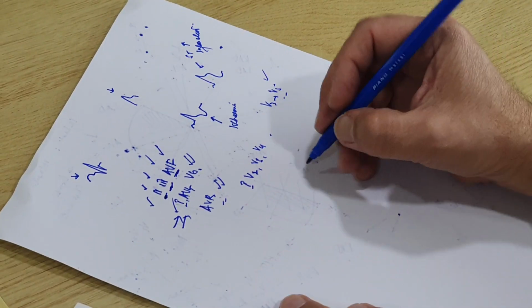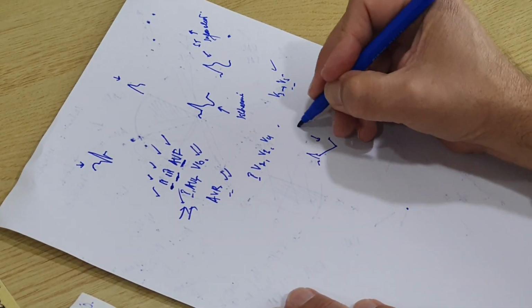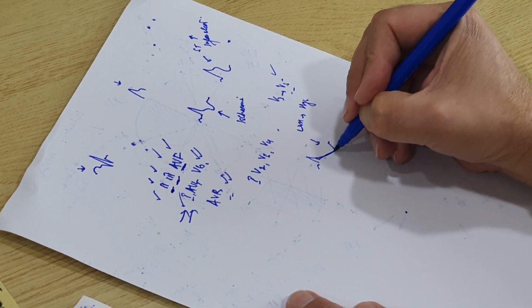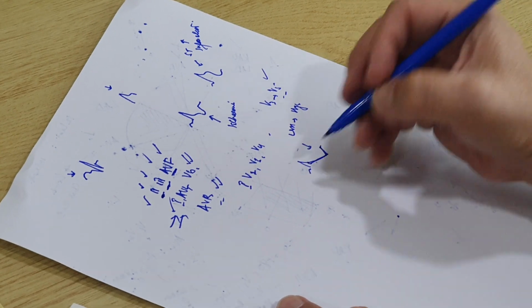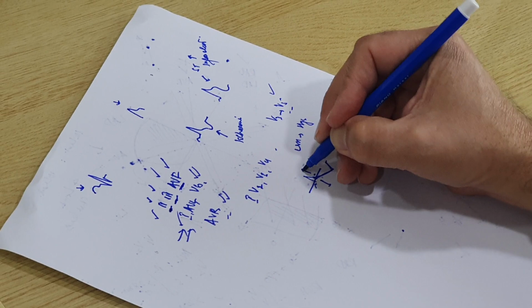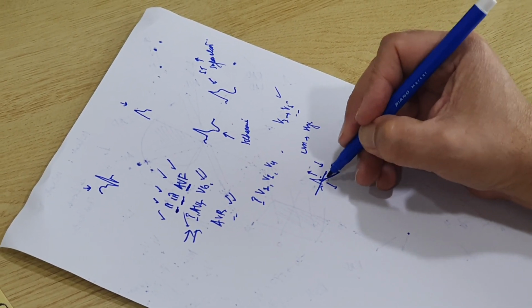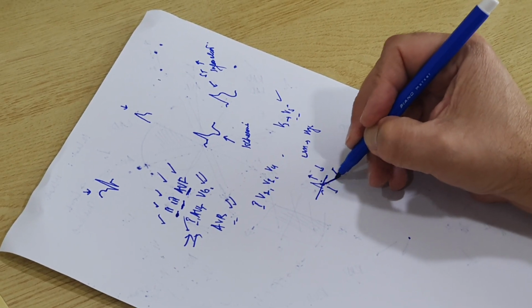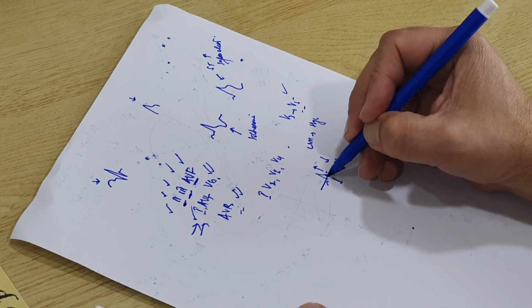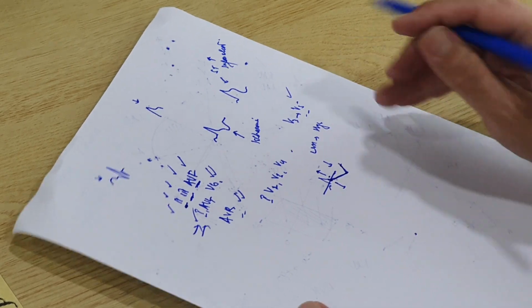for instance, a very common finding is the sagging of the ST segment, which is sometimes seen in left ventricular hypertrophy in hypertensive patients, and so the ST segment sags down like that. So this is not ischemia. The ST segment has to be above or below the baseline. If it's not above or below the baseline and it just sags from here, then that means this is not ongoing ischemia. So we have to look at the point of origin of the ST segment. So it has to either be above or below that.